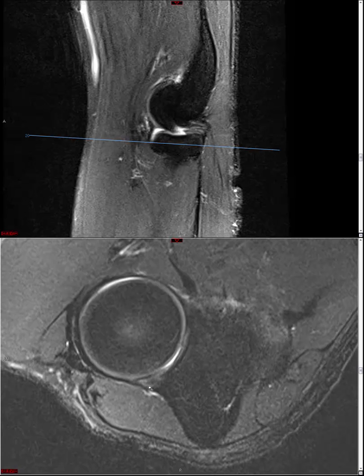So that's your lateral ulnar collateral ligament, and it keeps the radial head and neck from popping out posterolaterally from the rest of the elbow, preventing so-called posterolateral rotatory instability. Let's try to find this ligament on sagittal.